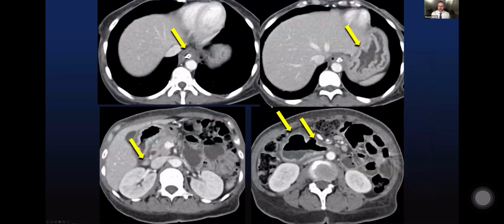Well, here's another case of someone with ulcers of the proximal small bowel. In this case, though, rather than being from the duodenal bulb like most occur, this patient has ulcers well into the transverse duodenum. She also has hyper-enhancing rugal folds. She has some esophagitis and a very sneaky hyper-enhancing nodule here near the pancreatic head. This is a patient with a gastrinoma and Zollinger-Ellison syndrome.